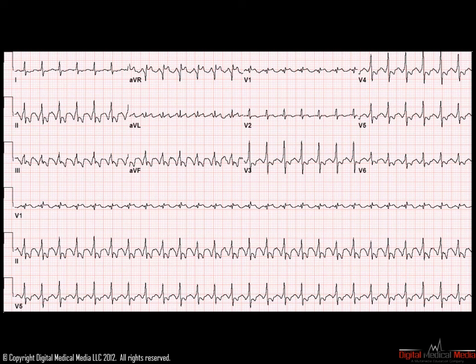The rhythm goes down the lateral wall of the right atrium and across the bridge of tissue between the inferior vena cava and the tricuspid valve annulus, then up the interatrial septum. This rhythm almost always circulates at 300 beats per minute in the atrium. Since the AV node has decremental conduction properties, the AV node cannot withstand conduction at 300 beats per minute. However, every other beat can propagate down to the ventricles.